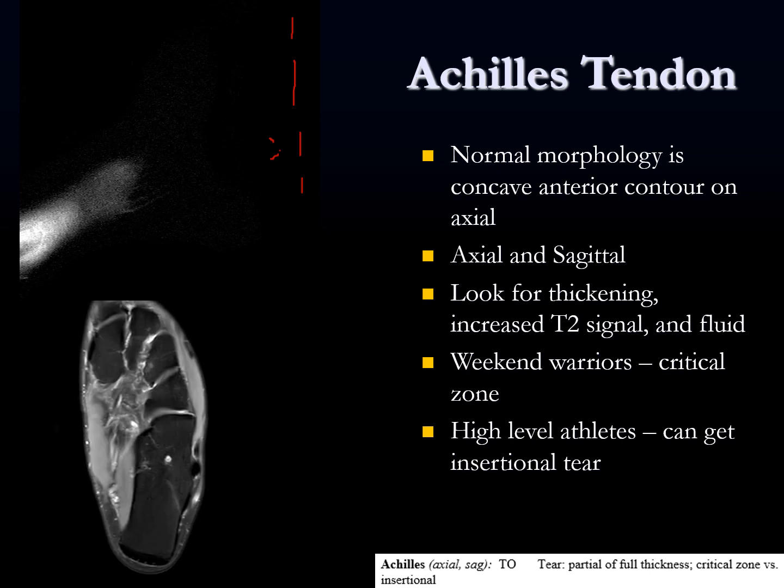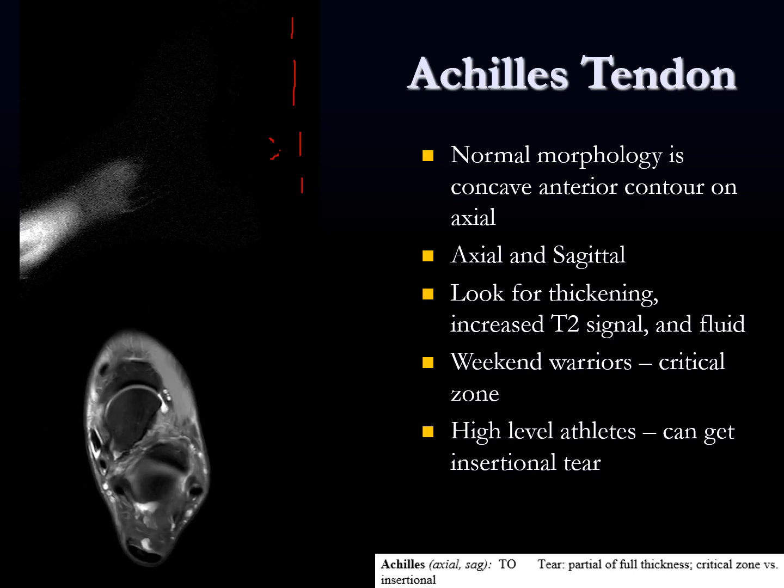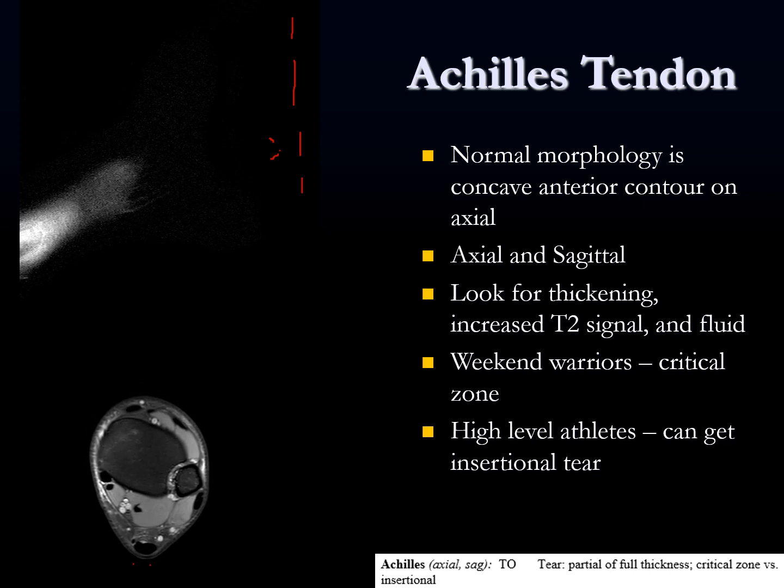And then axial would be the other plane to look, and just once again, to show this normal Achilles. This is going from low to high.